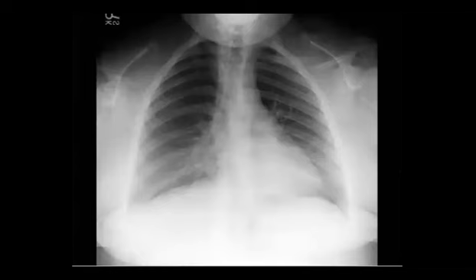So what happened here? Describe it. Yeah, cleidocranial dysplasia. Ala, nice. Cleidocranial dysostosis or dysplasia, with complete absence of the right clavicle, and the left clavicle already like fractured or absent. When you go here, what is the deformity in the skull?